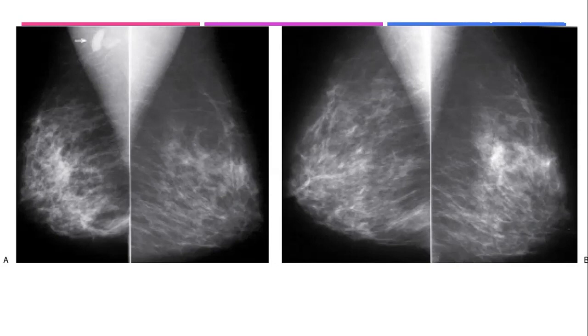What else, if you compare the two sides? There is a thick band structure. I can see it in the size of the breast. What about the breast size? It is smaller, it would be shrunken. Excellent, well done. This is a shrunken breast, shrinkage breast.